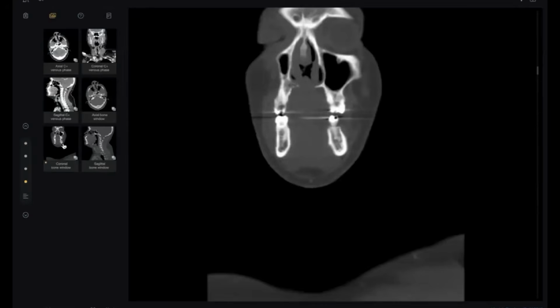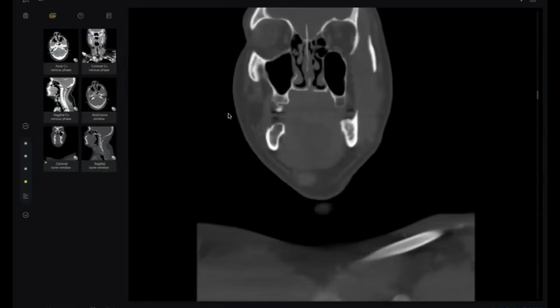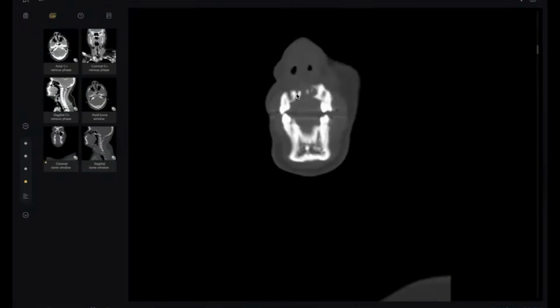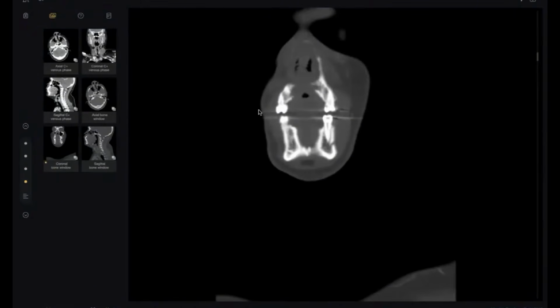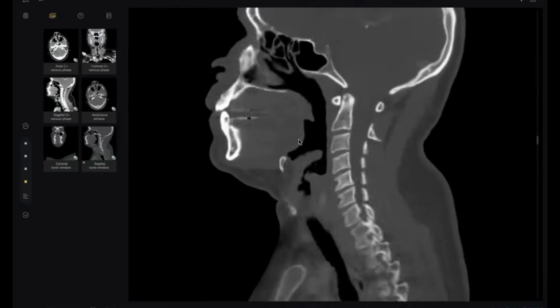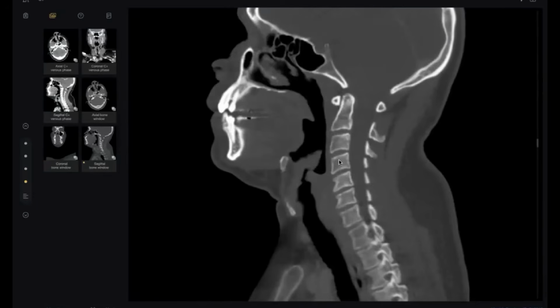It looks like a mass, by the way. Erosion here. So I can excuse you in this neck CT because it is really very atypical. Do you think if TB affected the neck, it will affect the epiglottis in the larynx without affecting the spine? Not logical.